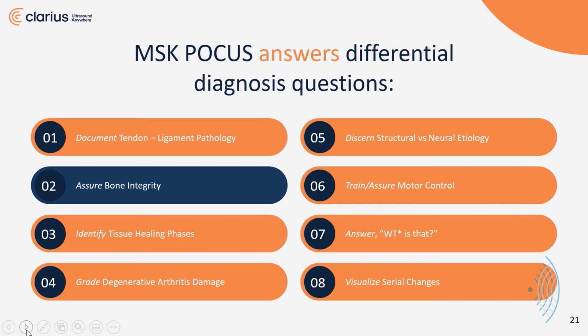We can see avulsion fractures, where we can identify pieces of material from the bone that show up like gravel or debris in soft tissue, and that posterior acoustic shadowing identifies them as calcific masses. We're able to identify bony erosion with osteochondral defects.